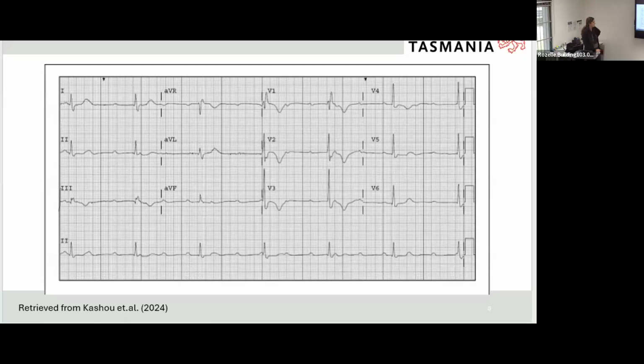One seems bigger and one seems smaller. Which one do you think looks bigger and smaller? Sorry. Because we do have our T wave, which is potentially. Me, I'm looking at the ones in between. So if you count the last QRS complex, between the third and the second last QRS complex, look at the P waves in that section there. They look quite similar. Yeah, like these ones. No, next these two, yeah, and keep going.